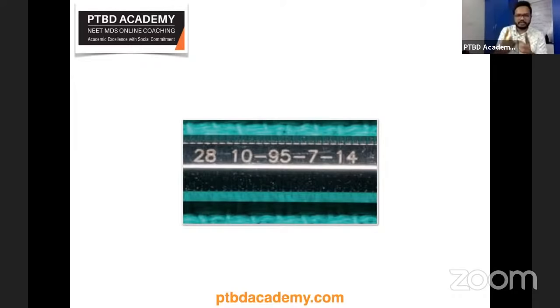Upon observation, you can obviously differentiate both, which we'll deal with in the next slide. But if numbers are given and you're asked to identify whether it's mesial or distal, what is this GMT? Mesial or distal? I'm asking you this question again. Is it mesial or distal? Yes, the primary cutting edge angle seems to be 95. So is it mesial or distal?